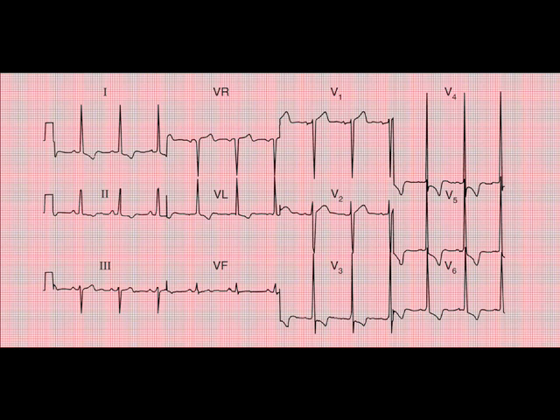So one would want to know more about this patient. Is there truly, an echo would show that, left ventricular hypertrophy, which may be a sign of prolonged hypertension, heart failure, which has a variety of causes, etc. Why this is suggestive also of left ventricular hypertrophy is those tall R waves are accompanied by upside down or inverted T waves, which is not uncommon to be associated with the tall R waves in left ventricular hypertrophy. Conversely, look how deep the S waves are in V1, little R wave to start with, then a deep S wave. So this is suggestive of left ventricular hypertrophy.